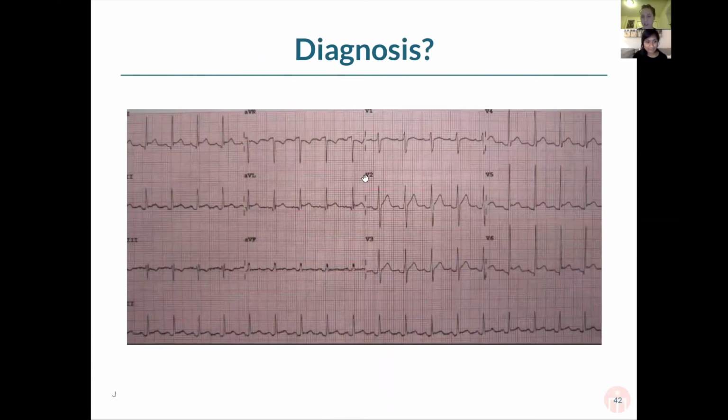Take a look at this EKG. Sorry, it's a little bit dark. I was taking this from a book where I could find the best example. But take a look here and see if you notice anything particular standing out. We're going to just go through 2 EKGs here briefly before we have to wrap up on some of our time. So see if there's anything you notice that's going on, what your differential is. Feel free to type in your answers in the chat box here, and we'll talk about it a little bit. In the meantime, if you have any more questions about anything else, shoot us a question in the Q&A box, and we can always get a hold of those as well.